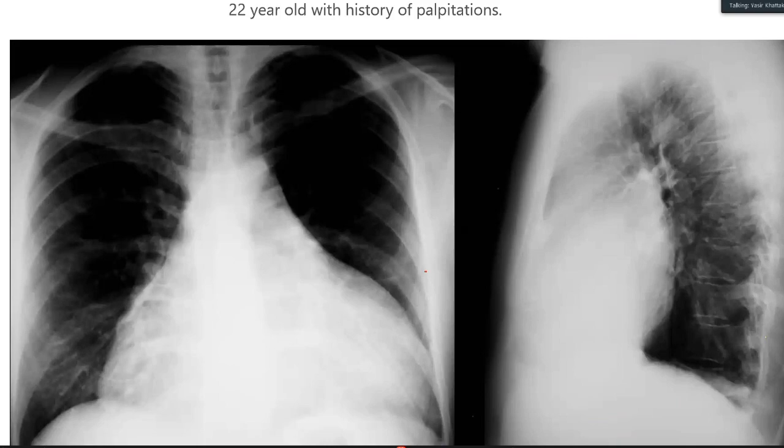Yes. Okay. For all the residents who are looking at this radiograph, whenever you have this kind of a heart shadow, which looks so big, there are three things which come to mind. Sometimes this can be an Ebstein's anomaly case. I'll come further to it. Okay, I'll take the case from here. We have left with half an hour. So after this, I'll show you most of the cases myself so that you can see the cases.